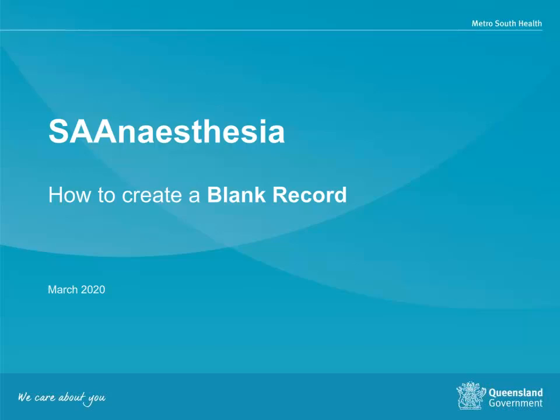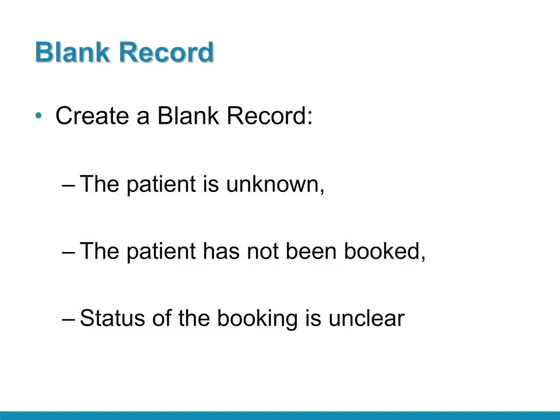This video will demonstrate how to create a blank record in SAA anesthesia. A blank record facilitates the creation of an anesthetic record in situations where the patient has not been scheduled due to critical timing, the patient is unknown, or perhaps the status of the booking is unclear. For example, a patient was checked in incorrectly and the booking is being corrected or rebooked.